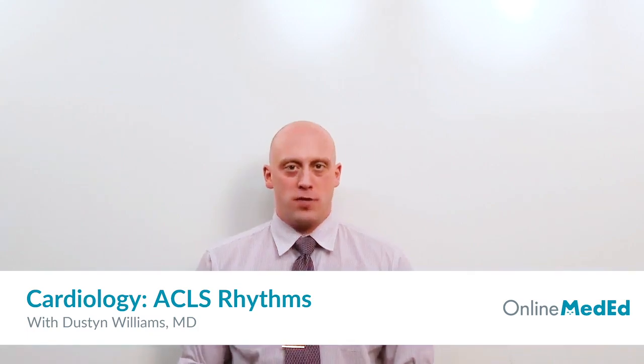Teaching the interpretation of an EKG is a fairly advanced skill. If you want the details of that, go check out the intern guide in the intern book. What I want to do in this video is talk about the different types of arrhythmias you're going to see on the test. On the test, it's more about pattern recognition than it is in real people. They're not going to give you one that's variable, it's going to be very clear.